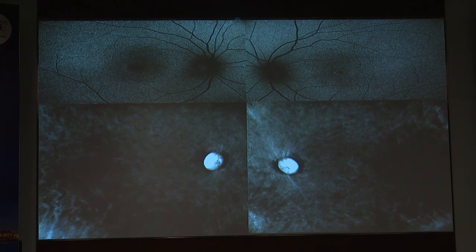So if the RPE becomes diseased, whenever there is an accumulation into the retinal pigment epithelium, from any disease which causes accumulation, our retina becomes such bubble-like things. It starts looking like this.